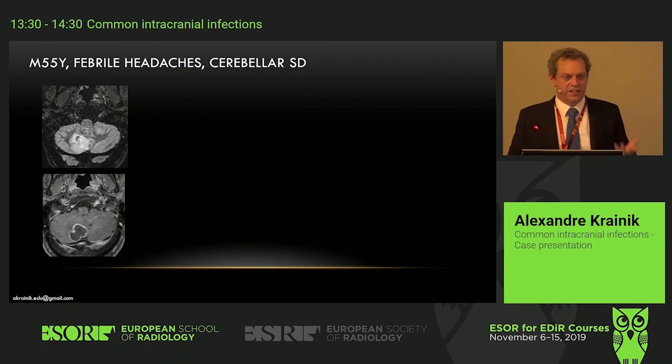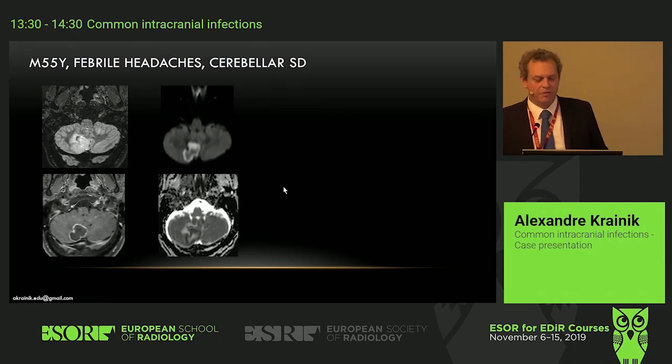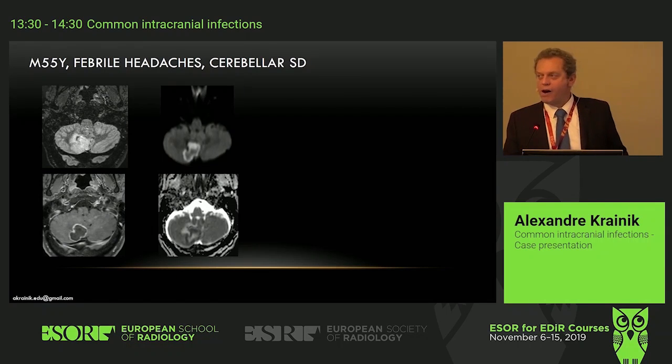Okay, then the content here is always two things. There's the capsule or the rim of the lesion, and the content, necrosis or whatever. What you see on FLAIR image, the signal is not suppressed like water, then it's not pure water. Then diffusion is quite helpful. It's got a high signal ring on the DWI and on the ADC map it's got, well, kind of heterogeneous signal, and some of it seems a bit restricting.